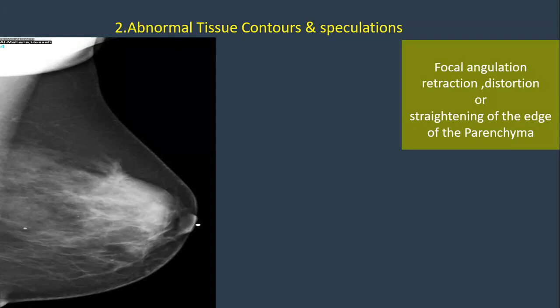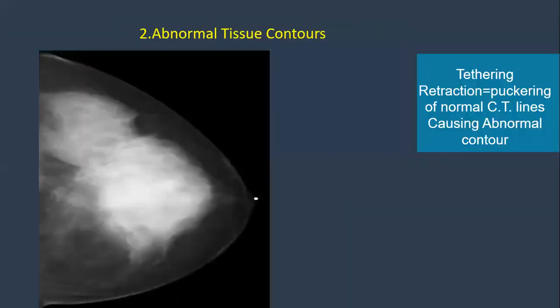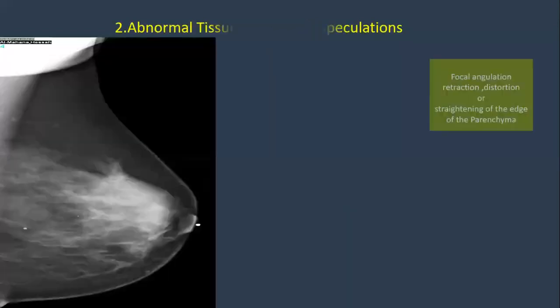You see, it is angulated. There is some angulation and some retraction here, retraction at one point and angulation at another point. And some straightening of the edge, as if there is something rigid in this area. Both the previous one and this one are my cases.